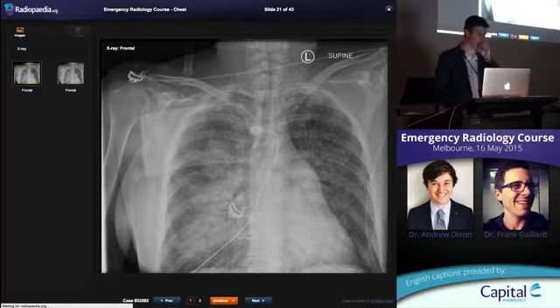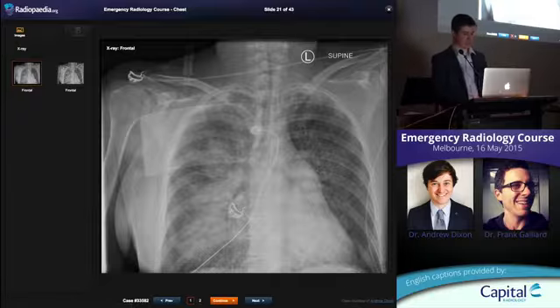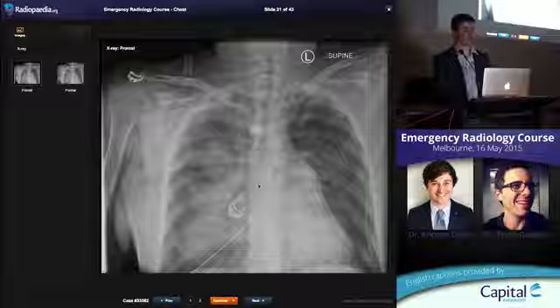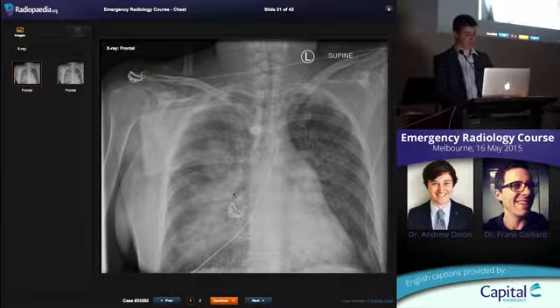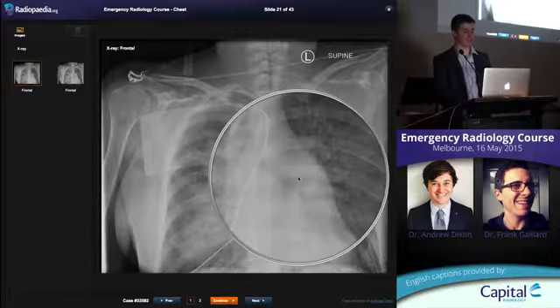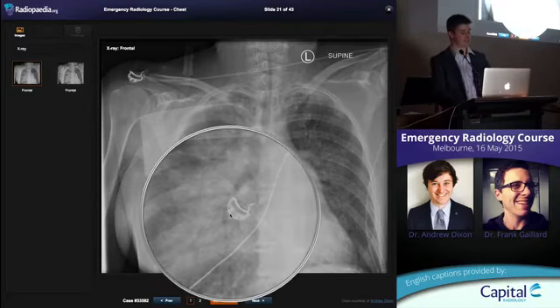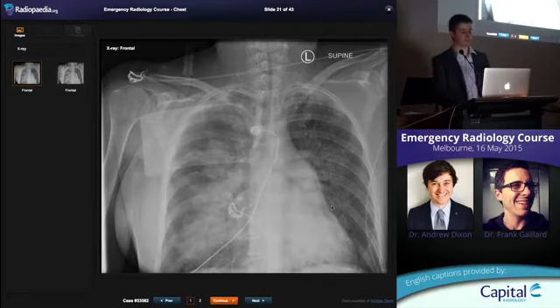So we're moving on now to do a little bit of pulmonary edema and fluid overload. This is your classic kind of patient presenting to ED with rapid onset shortness of breath, looking terrible. And a beautiful example again of this inability to trace the vessels out of the hilum, okay, but you can trace black branching things. There's an airspace opacity. It's more prominent on the right than the left, but it is bilateral. It's very central, so it's perihilar is the term we often use for that.